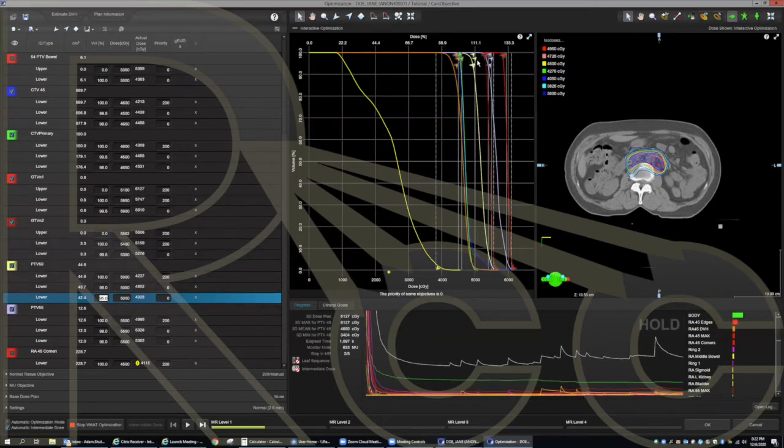It'll show a little point here, and you'll be able to visualize it and make sure that your DVH goes over that point. That means that your D95 is 100%, which is what I want in my case. Again, your doctors may be going by different protocols, may want something different, but the concept is the same. So you can either see the value here, or visualize it on your graph. Either way is a viable option.